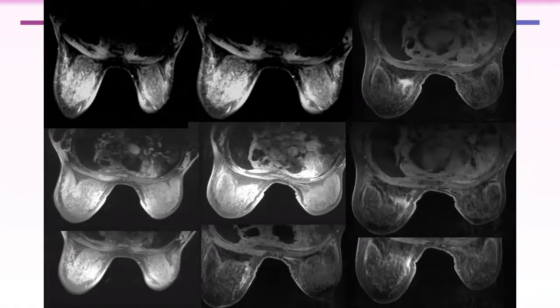What else? Could you see any additional abnormality? Inside the thorax. Excellent, well done. There is mediastinal lymphadenopathy. You can see the mediastinal lymph nodes in one image, this and this. And what about this structure? This is lower down.